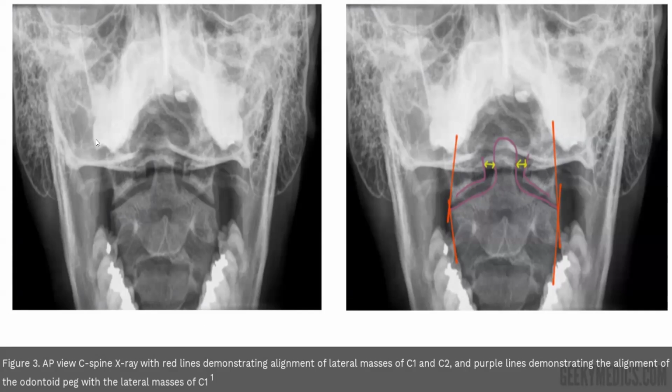Okay. So you should see the soft tissue here. Can you see the soft tissue? Yes, sir. Soft tissue here, soft tissue here, up here. But anyway, the most important are C1 and C2. If you can see C1 and C2, you can consider it adequate, no problem. Easy?